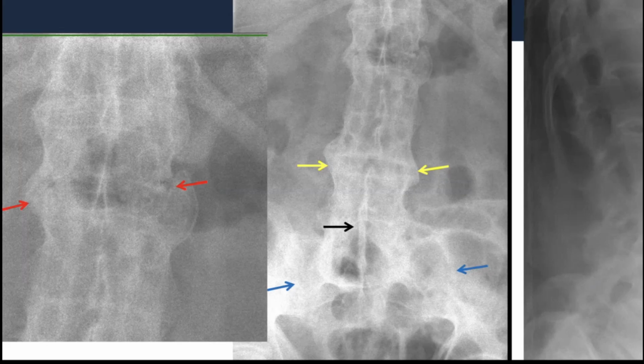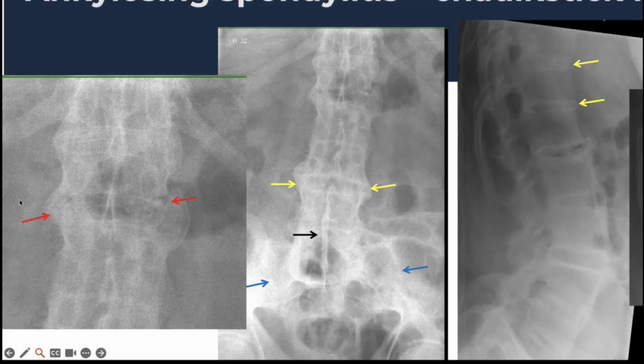Now, generally speaking, in MSK, smooth lines are generally okay. So we've got lots of these abnormal osteophytes which are along multiple contiguous levels, but they're very smooth and we're not too worried about them. But abrupt lines or straight lines, generally not okay. Okay. So here we've got this abrupt interruption of the cortex, which we're not happy about.